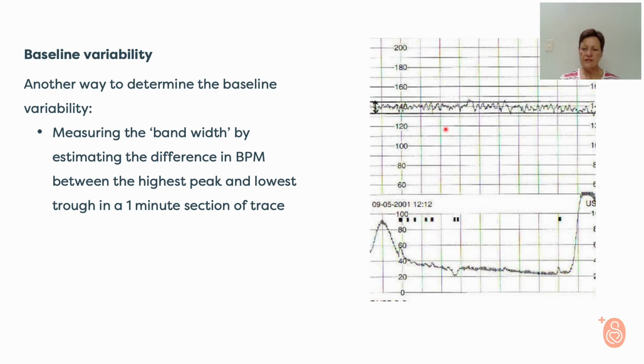And again, like I've said with drawing a line to determine the baseline, especially when you are inexperienced, there's absolutely nothing wrong with drawing the two lines on a CTG graph when you interpret the CTG.